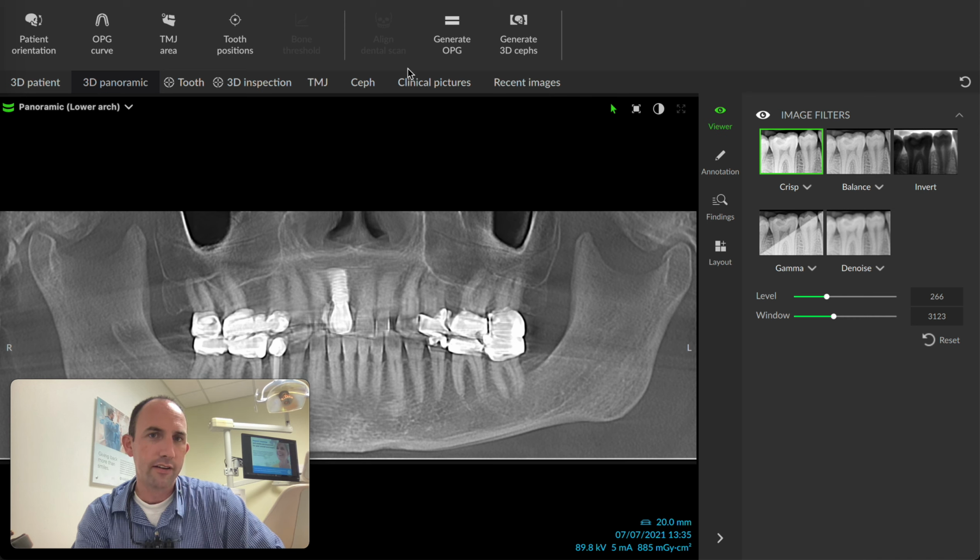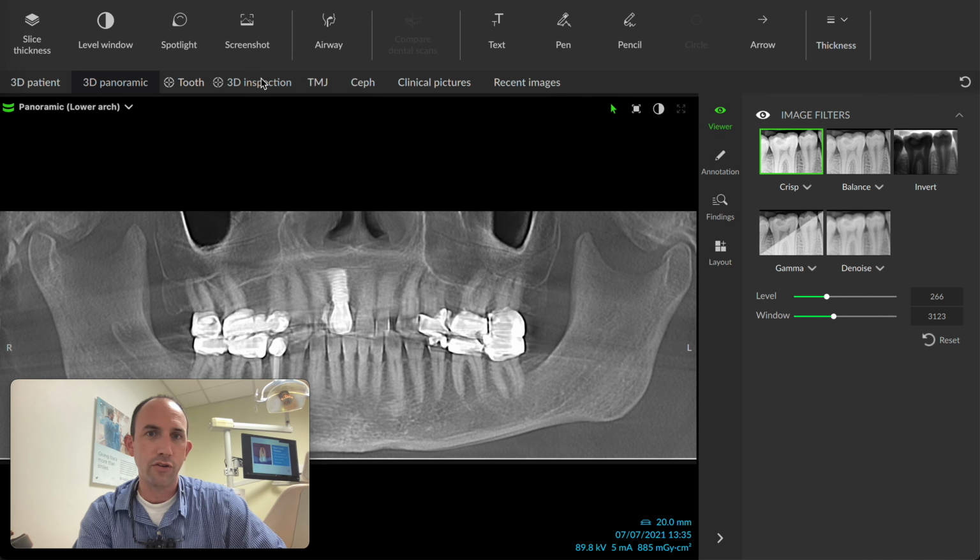Right, now I'm going to go straight up here. There's an Edit 3D Scan button, again, that's hiding because of the patient name there. There's also a measure, and then there's a diagnose. So I'm going to click back to diagnose. This is where we normally are.